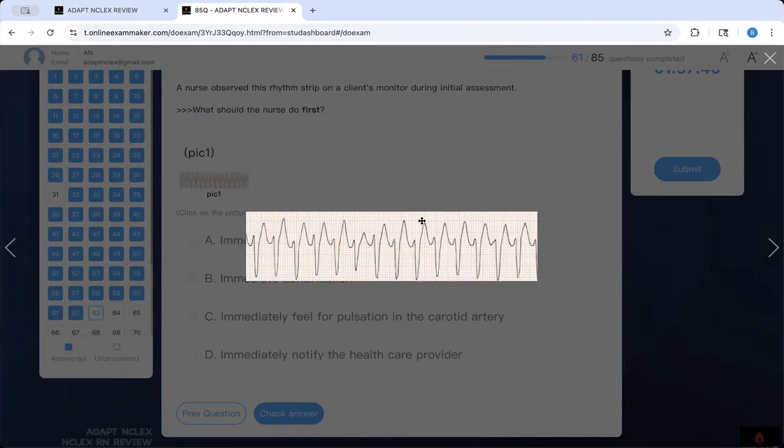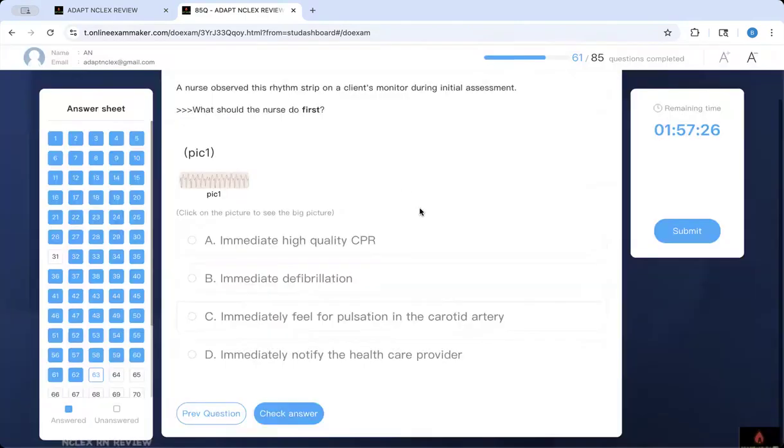What is the key? When you read the EKG, first you see if it's a standard EKG. It's not. You see atrial rhythm? Not. These are all ventricle. Therefore, it's a ventricular problem. Is it uniform? Yes. It's not fibrillating, so it's not VFib, but it's a VTAC. Therefore, if it's a VTAC, what do you know? What do you do? What should you worry about?